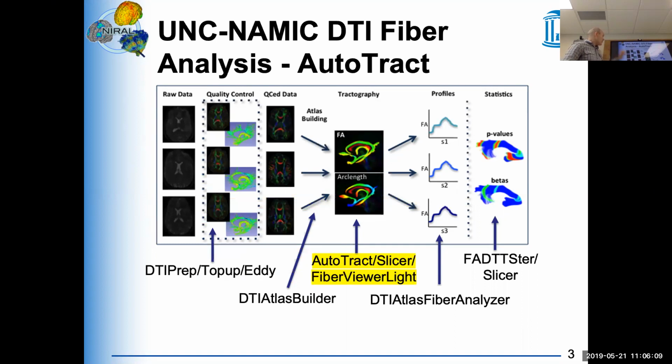And so the next step is I will look at this. Now, particularly down here, these are all different tools. The output of one tool usually is the input of the next tool. So it's possible, particularly on the command line, to streamline all of these together in a script, although we currently are not doing that. The reason is that after each tool, usually you want to do some quality control. But theoretically, you could plug this all into one mega module if you wanted to.